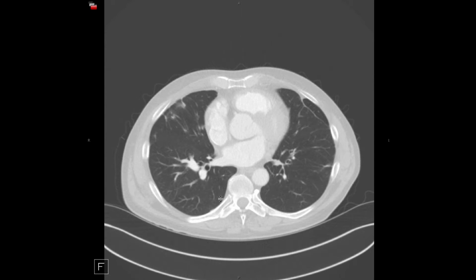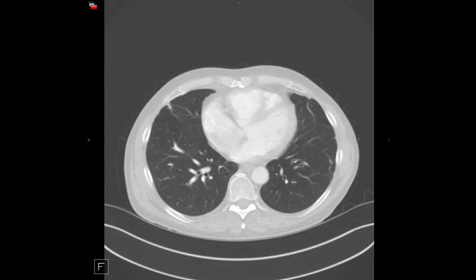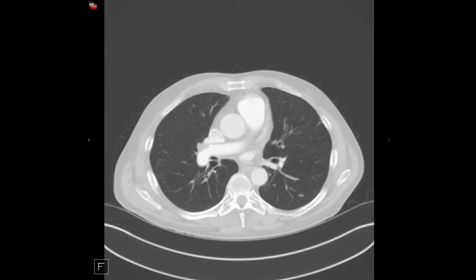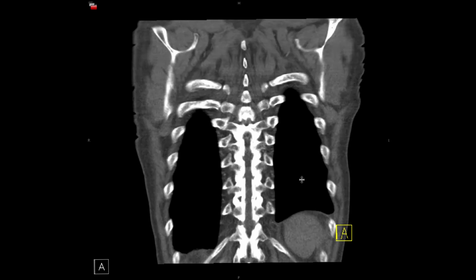So in the left lower lobe compared to the right lower lobe, you can see that we've got bronchus and corresponding artery. These arteries are enlarged because this patient has consequent pulmonary hypertension. On the left side, we've got very small arteries in the left lower lobe. So this, again, corresponds to the abnormal perfusion, asymmetric and patchy because of the differential involvement of the different vessels by webs and chronic PE.